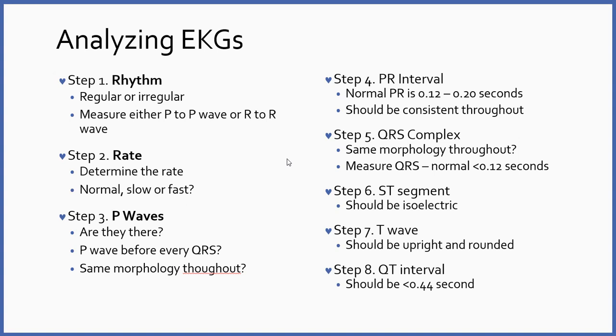We look at the ST segment. We know that that's the time between ventricular depolarization and repolarization when the line should be isoelectric. An ST that's elevated above baseline is ST elevation and not normal. Below baseline is ST depression and also not normal. You'll have to have more assessment and information to figure out what the specific problem is, but we know it's not what we want.